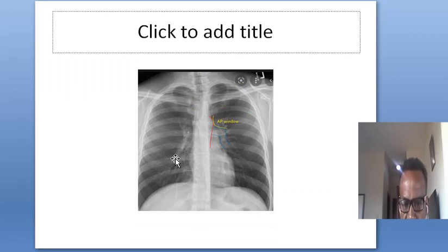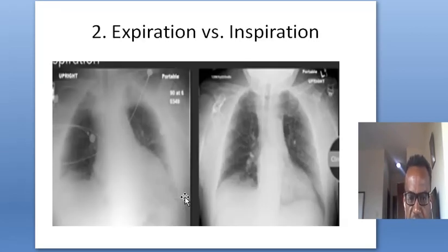So if we see this chest X-ray, the medial border of the clavicle is here on this X-ray, and here on this clavicle, and here on this clavicle. So this one is very far from midline. So there is some rotation making the hilar more marked on one side.